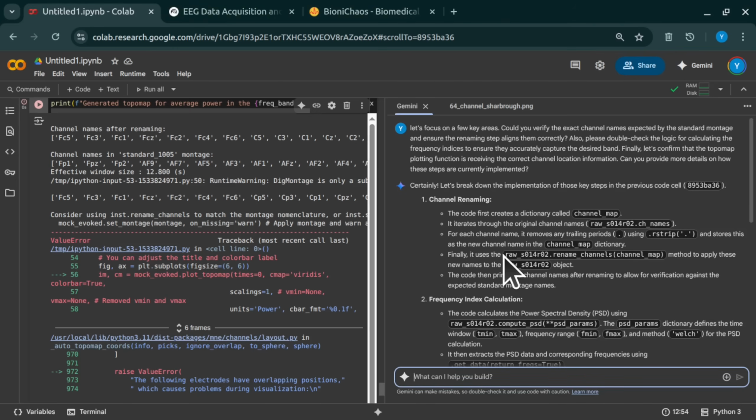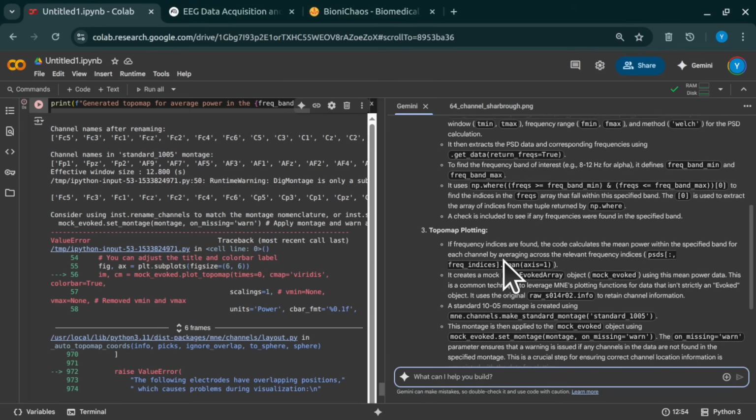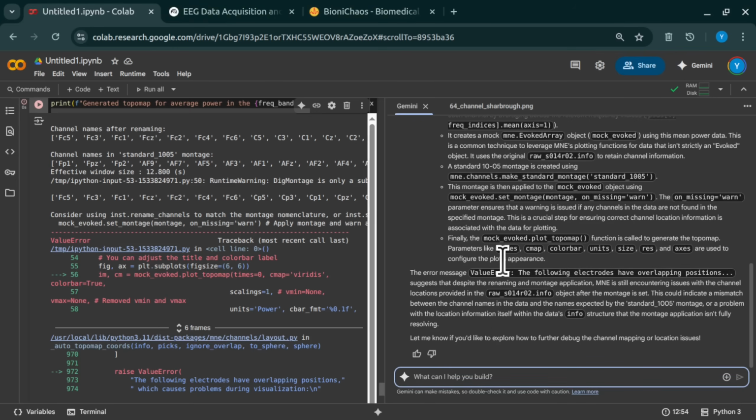Yes, so can you overview the response from the developer? There seem to be a lot of issues. Can you respond to them directly? So review the response and respond to the developer. Certainly. Regarding the channel renaming, it's crucial to ensure the exact match with the standard montage.